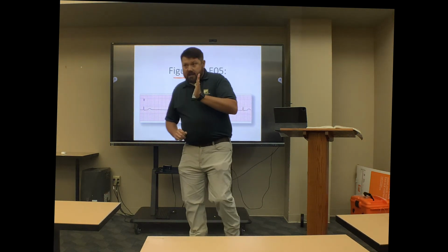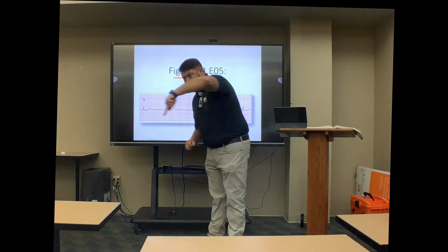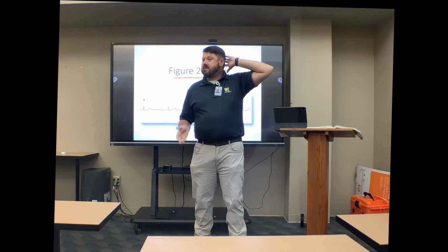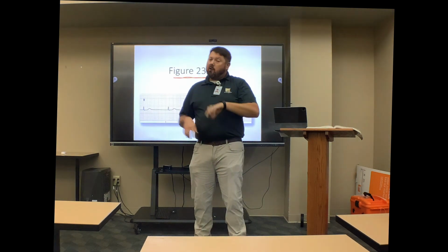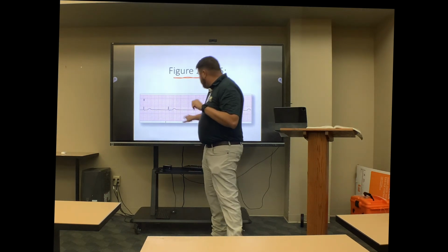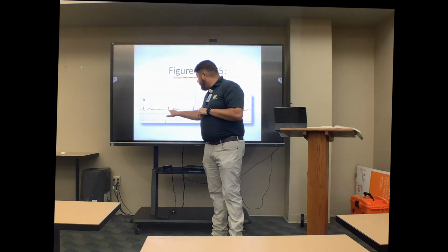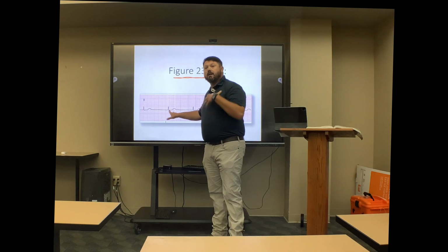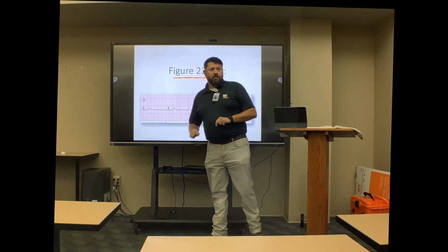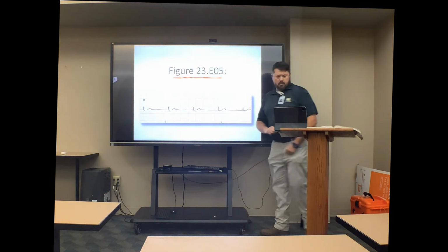Now, what do we know about an S wave? An S wave is supposed to come down and be sharp, right? It's not really supposed to do like that. If an S wave does like that below the baseline, a lot of times it's going to be some ST depression or something like that, or it may be some other issue, digoxin, which is going to be very dramatic. But it doesn't really do that, right? It's not sharp. So the atria is getting retrograde conduction there, right? So what are we going to call this? Junctional escape. Oh, y'all are so good.